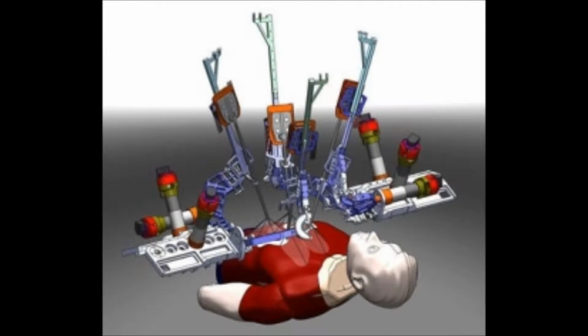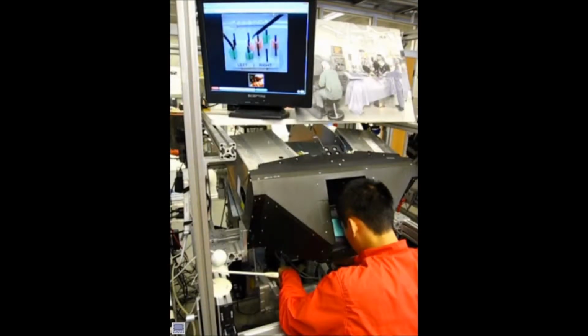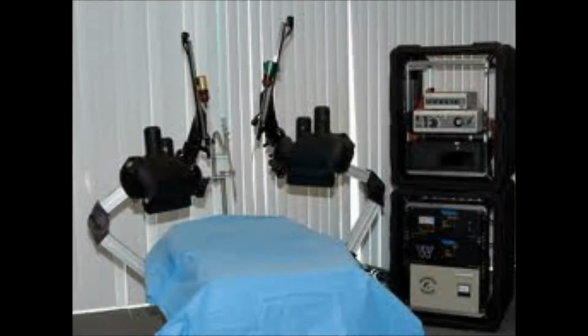The goal was to have an open-source robotic system that allows the surgeon to control the robot from a distance. This concept is called telerobotics. With telerobotics, a surgeon can be operating the robot from a safe, secure location while providing surgical medical care to an injured person across the room or even across the country or the globe.